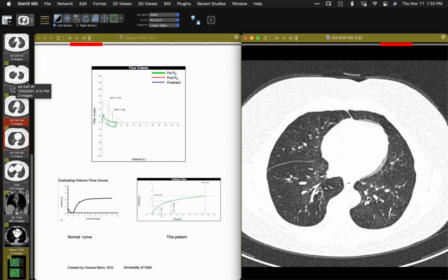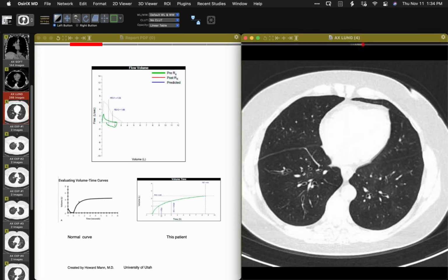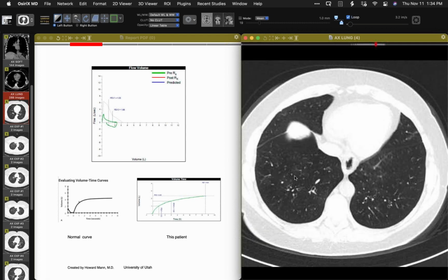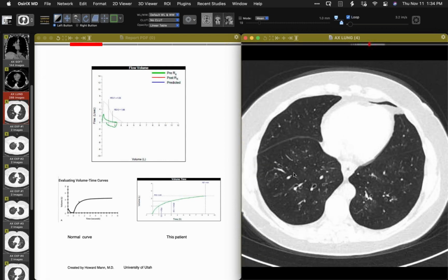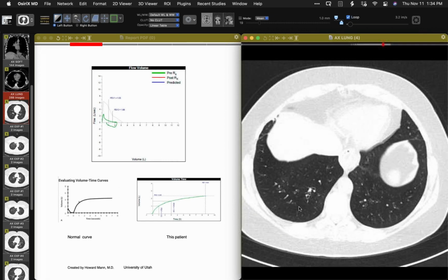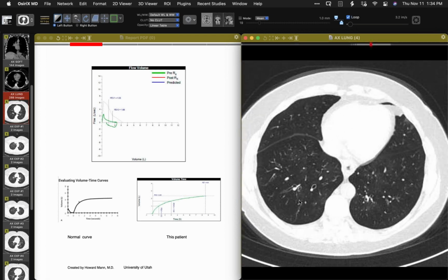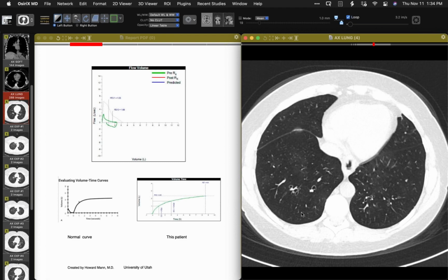So that is also profoundly abnormal in this case and goes with a lot of vascular change caused by the ventilatory problem. I mean, there are no vessels out at the periphery in that right lung base. So relative hypoxia and hypoxic vasoconstriction. Yeah, that's right. I think the vascular stuff is profound in this case. It was visible on the chest radiograph.